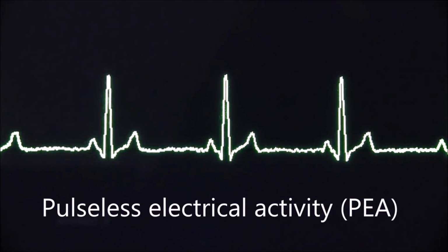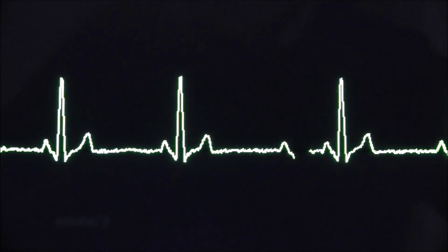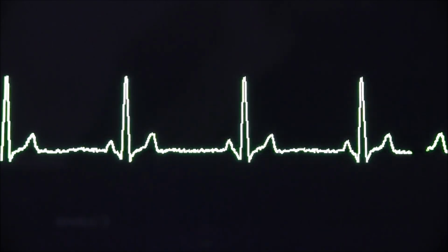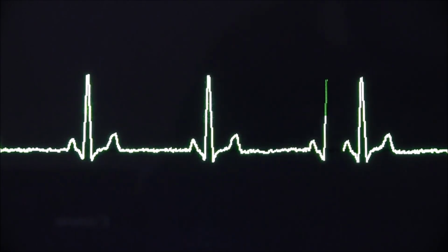Now there's another type of cardiac arrest called pulseless electrical activity. And that's exactly what it says. There is no pulse, but there is still electrical activity going on in the heart. And the waveform of that electrical activity can vary quite a bit, but it could look something like this, almost like a normal, in this case, sinus bradycardia. But the key thing is there is no kinetic movement of the heart. So the depolarization of the ventricular and atrial myocardium is going on as normal, but the heart muscle is unable to respond to that.